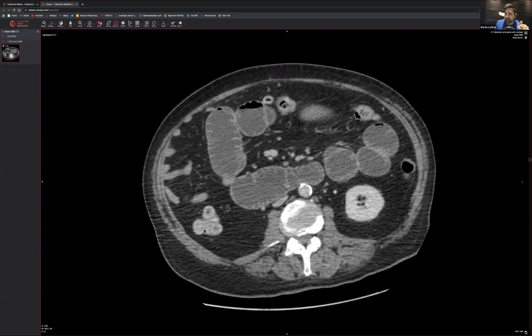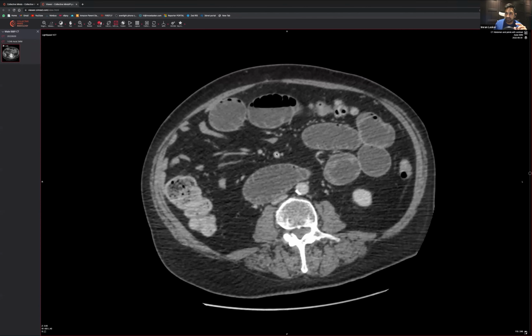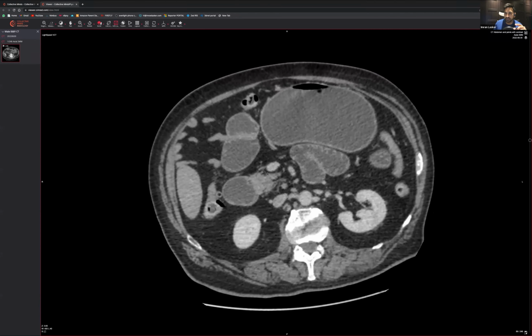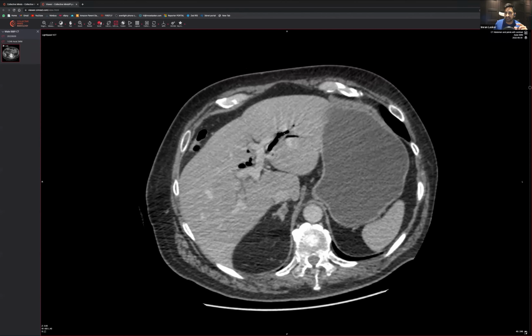If the bowel is dying, you get air within the bowel wall. Not air within the bowel, as you see here, but air within the bowel wall, which must mean there's necrosis of the bowel wall. The bacteria start eating, and the air starts to travel into the venous system. It goes all the way up into the portal venous system, into the actual portal vein, and then it starts to settle within these areas.